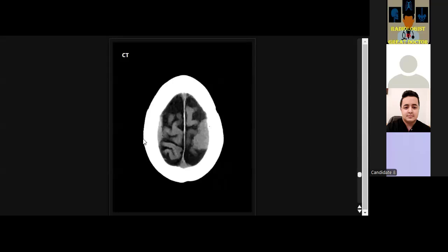Okay, neurofibromatosis type 2 can be diagnosed earlier, but I'll tell you the history. This patient is a 75-year-old female with a palpable breast lump. What is the diagnosis? Okay. So then this could be a metastasis from breast carcinoma.